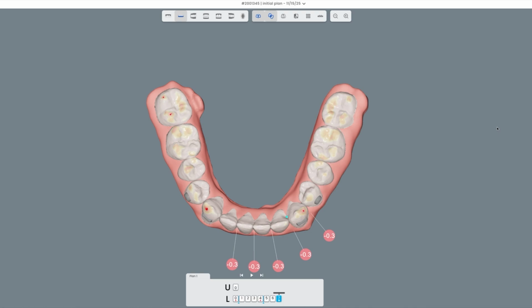This is another one of my favorite cases that come in. uLab has virtually removed the retainer for us. Typically, the way that we work it, the patient comes in, we just remove the retainer and get started with the trays. So a couple things we look for, we go through the same process.